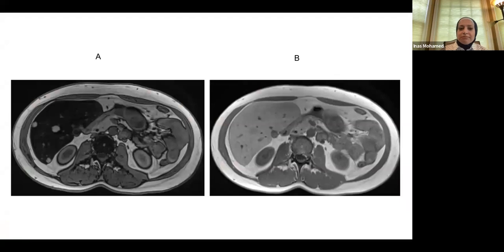Okay, so this is a fun case, as you say. It all depends on what the sequence is. Again, we have to know what sequences we're dealing with. And I'm talking about these lesions in there, these ones, okay? What do you think that is? Okay, I'll give you a second to look at it, and then I'm going to show you the options.